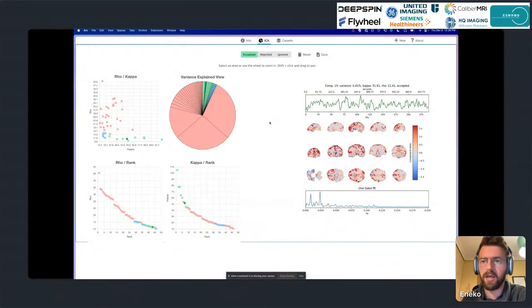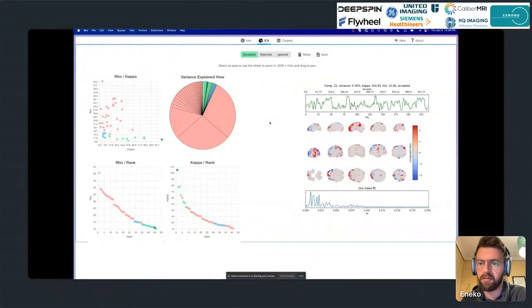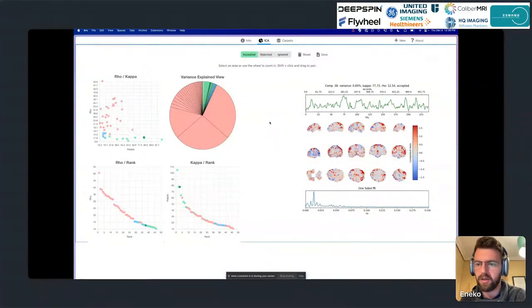So yeah, I'm gonna go through them, and if anything looks funny, I'll reject it. But so far, it looks like TEDANA did quite a good job.